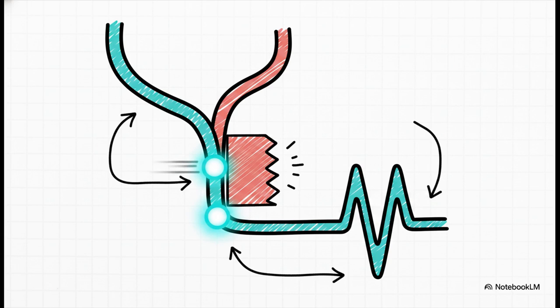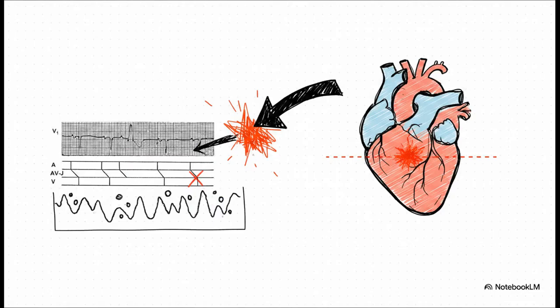The wide morphology is purely a result of that physiological difference in refractory periods between the bundle branches. It's a rate-related conduction delay, not a ventricular ectopic beat. This latter diagram provides a fantastic schematic for what's happening during that non-conducted beat.